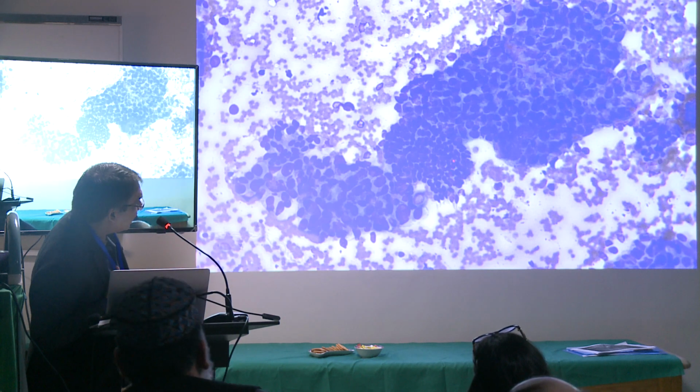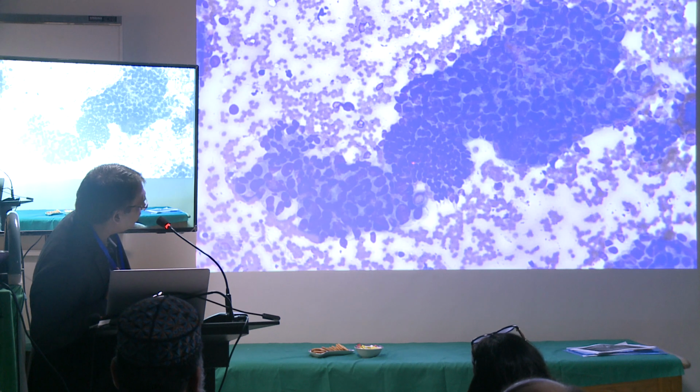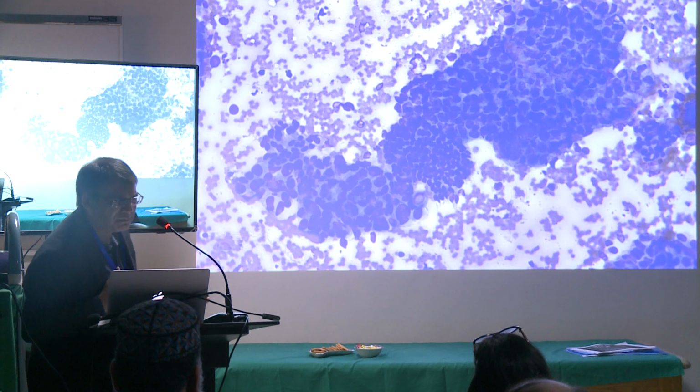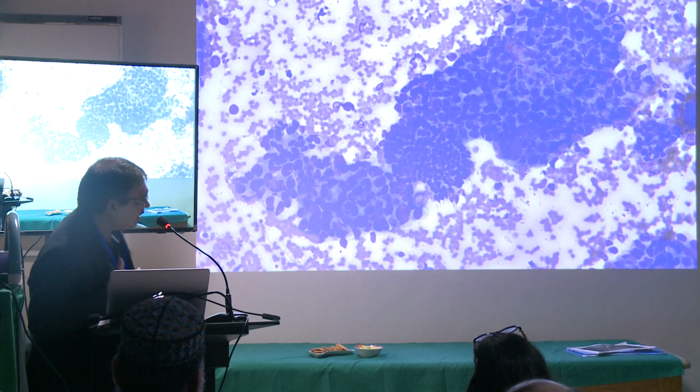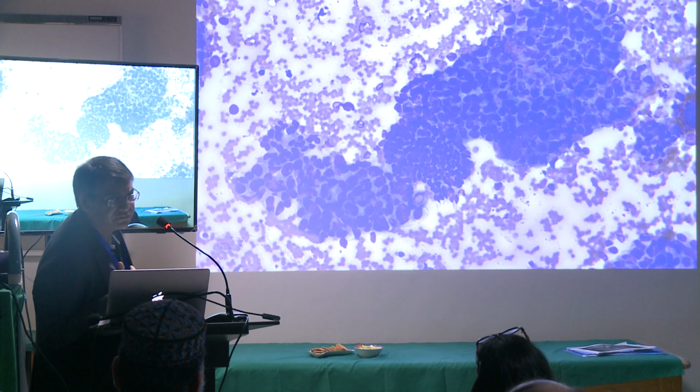That's not the case right here. These cells, even though they are kind of close to each other, ductal cells can look like that. But their size is not much different from the RBCs. So that's what I meant by a perfect example of normal cells and abnormal cells here.